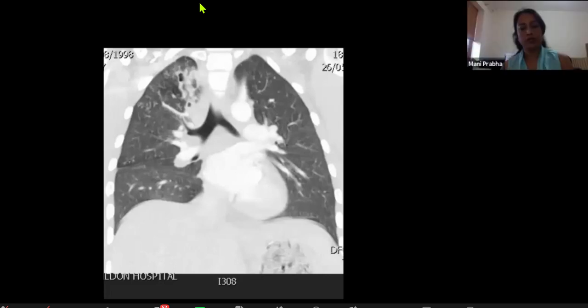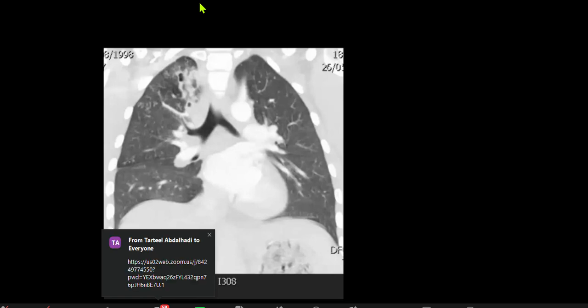Okay, so I presume this is a CT of the same patient? Yes, it is. Okay, so there's cavitation in the right apex with tree-in-bud nodularity, as well as bilateral hilar adenopathy. The left lung appears to be clear. There's no pleural or pericardial effusions. There's no abnormality in the imaged bones. So findings will be most concerning for primary TB. Yep.